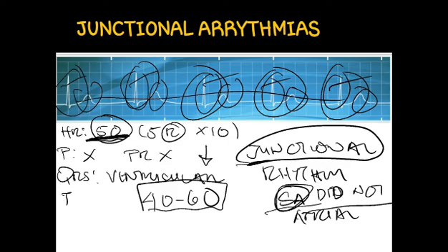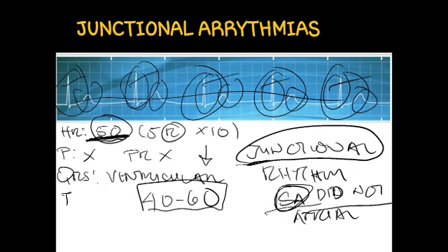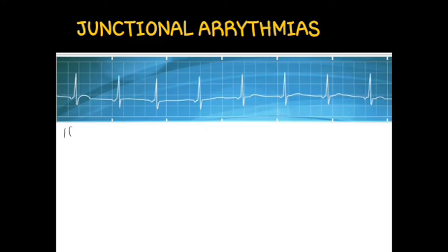Okay. So next rhythm. Okay. So the next rhythm will be this one. So this one is a junctional rhythm. Then for the next one we need to check the heart rate.